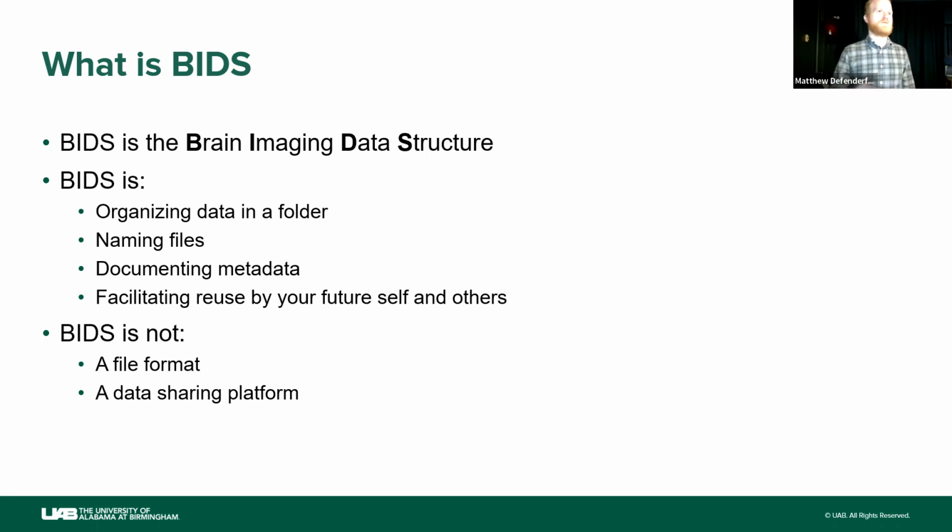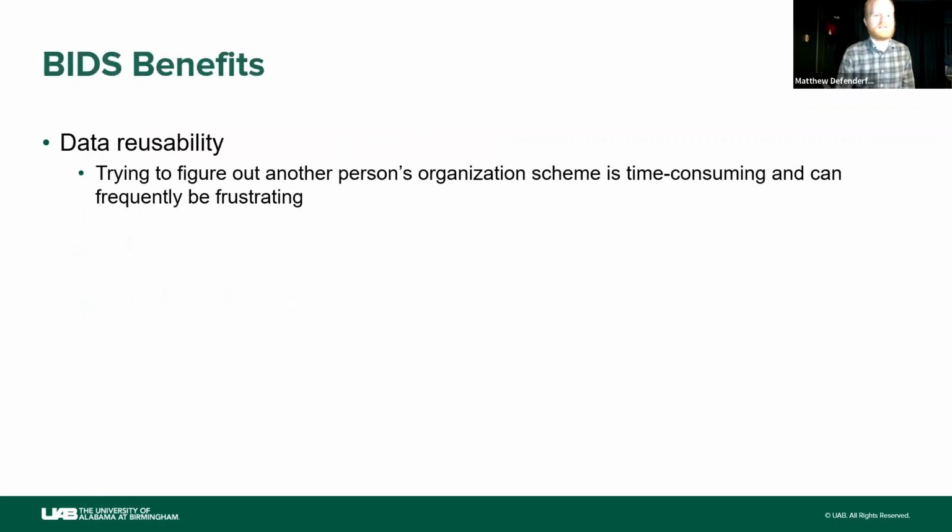So basically what you start with for BIDS is a series of raw DICOMs that just come straight off of the scanner. What you end with is a certain amount of raw data in a NIfTI format that is structured in a very specific file system and has a very specific naming structure. So you're not doing any sort of alteration to the data moving from raw DICOMs to a BIDS organized NIfTI system, okay? So what are the benefits to BIDS?